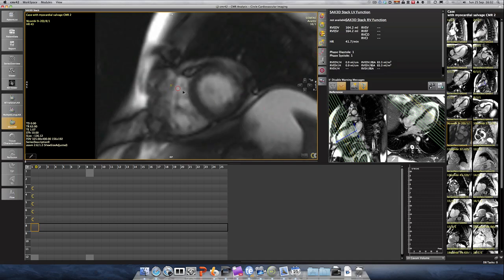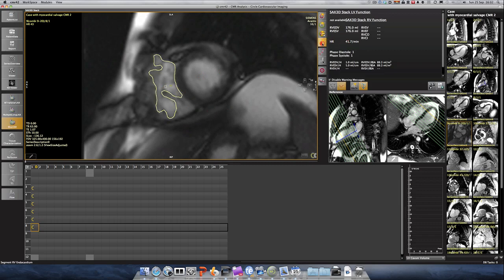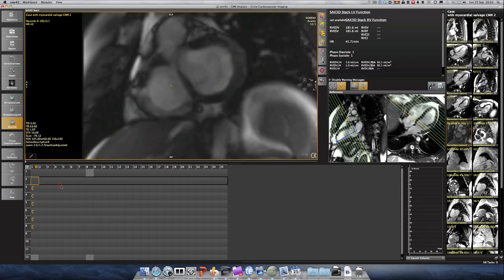So now this wouldn't be so good. As I've toggled the endocardial contour, I actually double click to get rid of this. Now I can move this so that the circle sits in some brightness, and I click this and I can grow this. Now this isn't perfect, so in that case I might just decide let's just get on with it and I'll manually help. But it did a good start. So that's really how you want to use the automatic contour detection, and you do the same then in your systolic phase. But what I do recommend is that particularly the basal slice, if you want to include a little bit here, just do it manually.